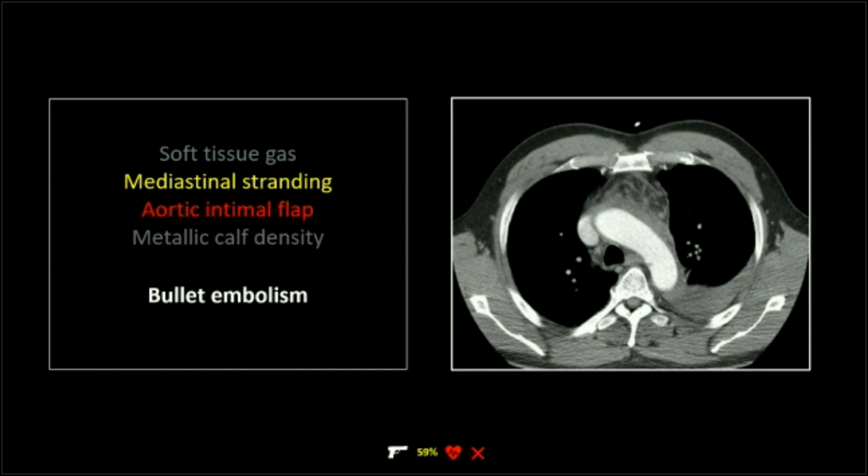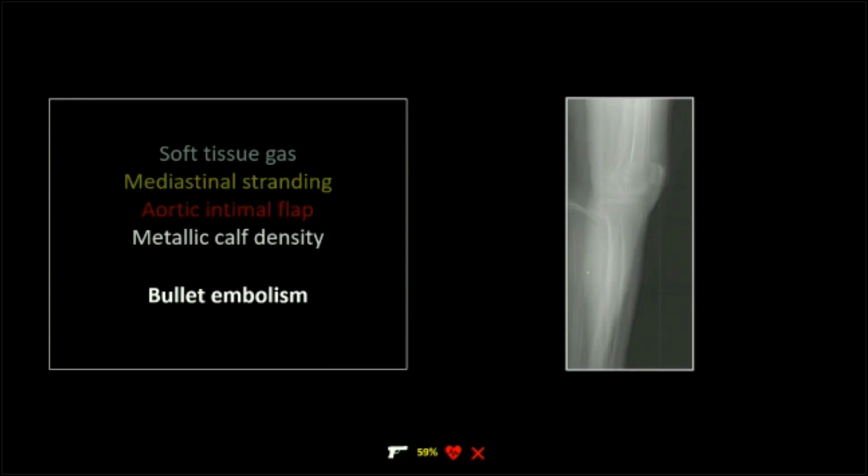Now, the funny thing about this was one of the first QAs I ever saw. I was on the QA committee, so this must date to 2005 probably. And one of the first cases they ever asked me to review was this one. I looked at it, and the radiologist had reported on it and said, no pellet is identified, but there's so much hilar calcification it might be hidden. That's unlikely if you're really looking for metal.